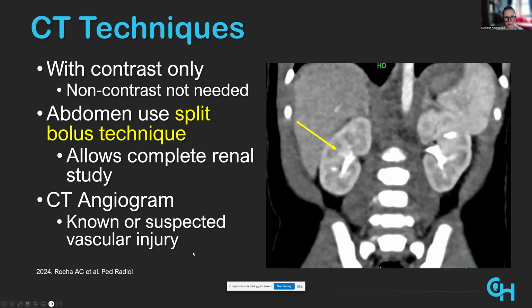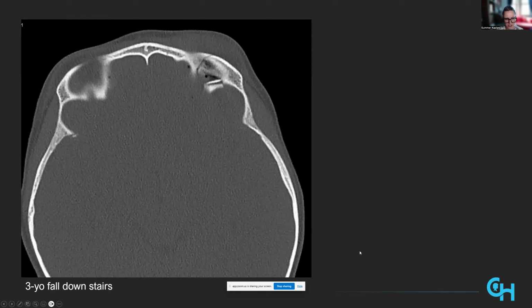All right. So these are some cases people can take. I've got 15 or so cases, and about half of them are for you to take. And then I figured we'll run out of time, so the other ones we'll go through, and I'll show you some findings. Does anybody want to take this case? Sounds like no. I don't mind going through it.